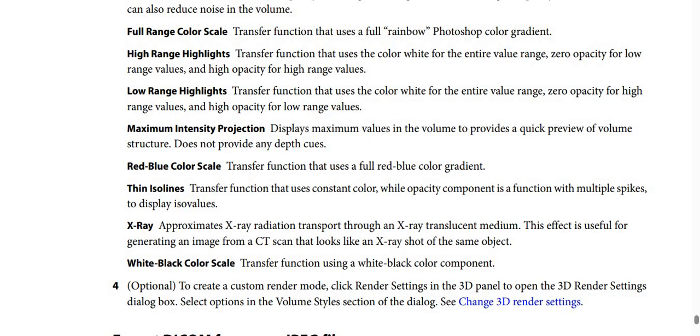And next, isolines, a transfer function that uses constant color, while the opacity component is a function with multiple spikes to display isovalues.